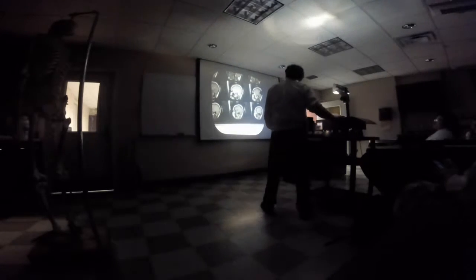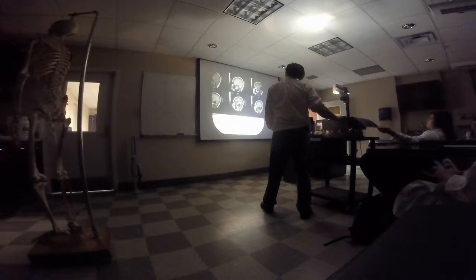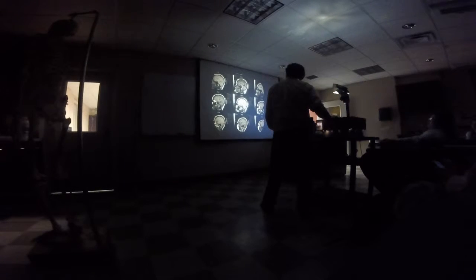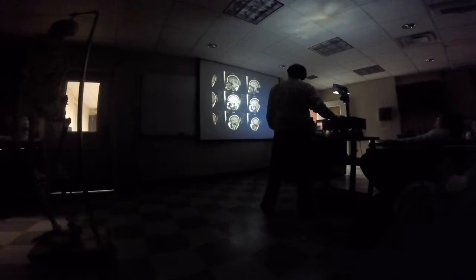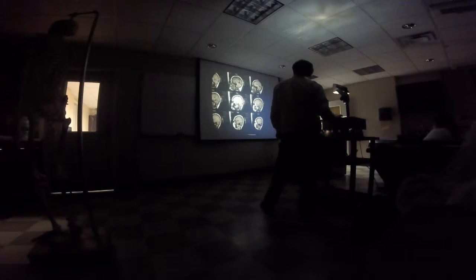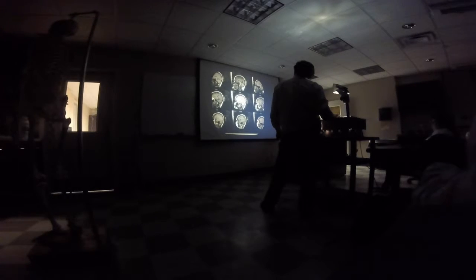Why does it look like that? It's deformed. Is it just because of the cut? The location of the bottom right pictures, all of those look deformed, but obviously they're not. Is it just because of how these views are sagittal, and you lose it because it's way off the midline? Okay. Some people would call it parasagittal.